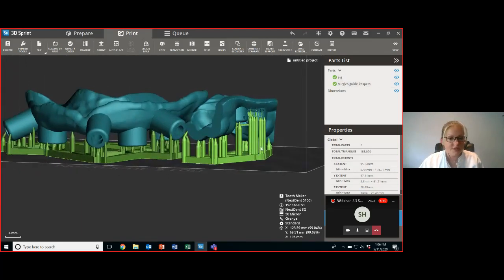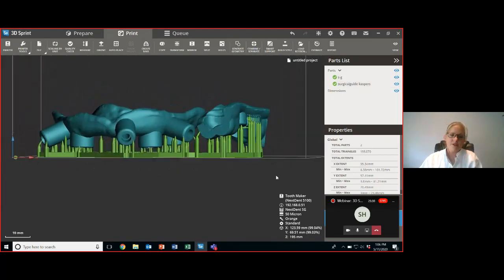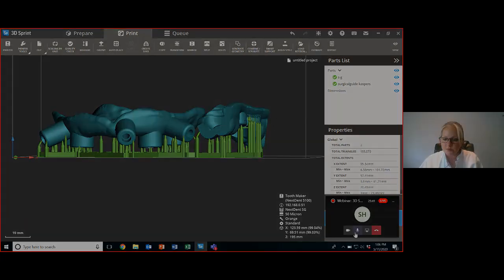Now you still can keep using the thick one. If you do, you may have more adjustments to make. So I would encourage you to start transferring over to that fine tip support. And I'm going to show you, I actually printed both. So I'm going to turn off this and you'll just focus on my camera now.